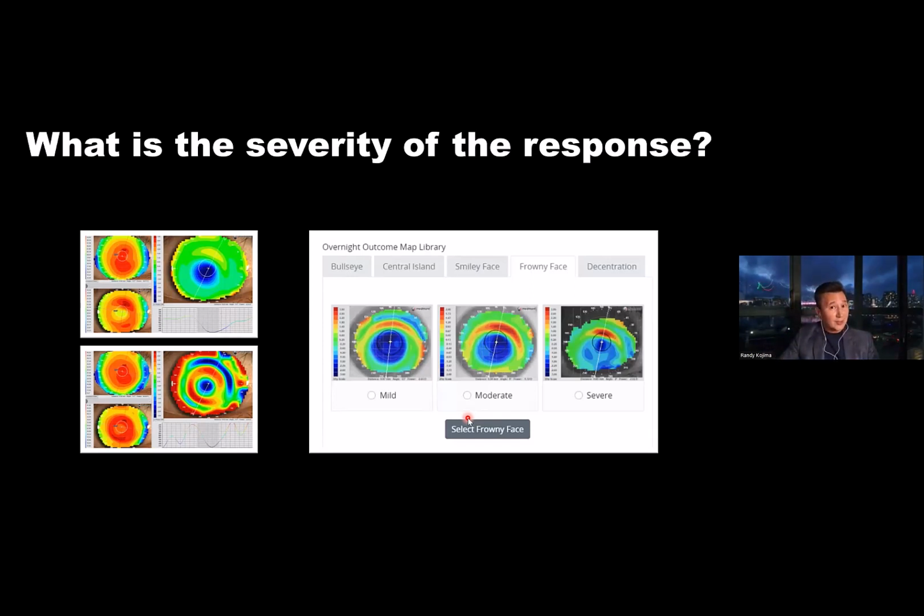So we're going to fix that. But by what degree or what severity do we fix it? Do we make a mild change, moderate change, or a severe change? When in doubt, always choose moderate. Bethany and the consultation team is going to tell you use moderate routinely. That's the one that's going to create a significant change in parameters.